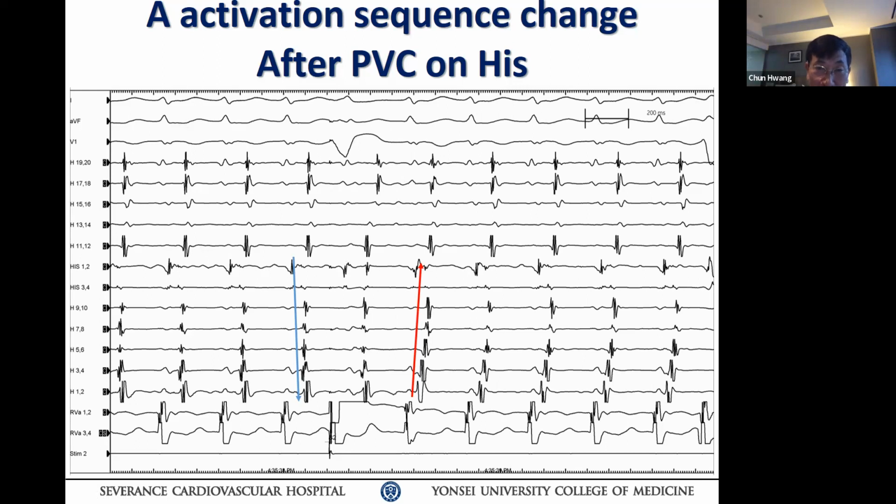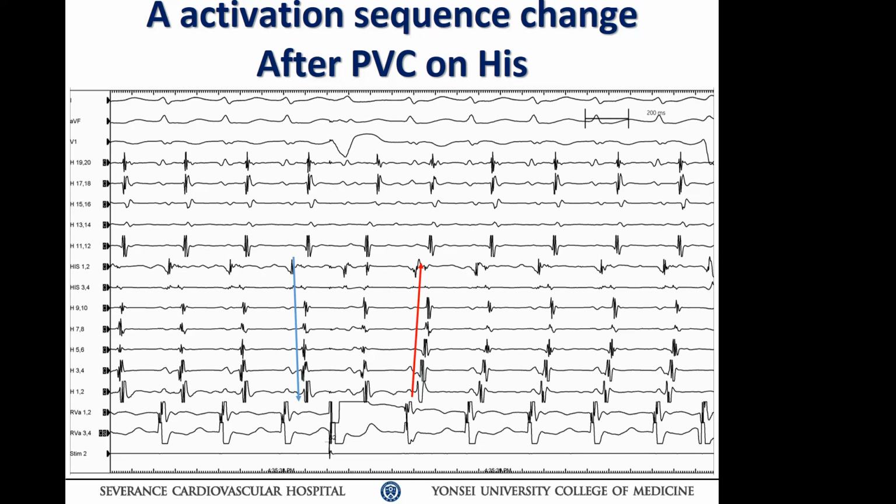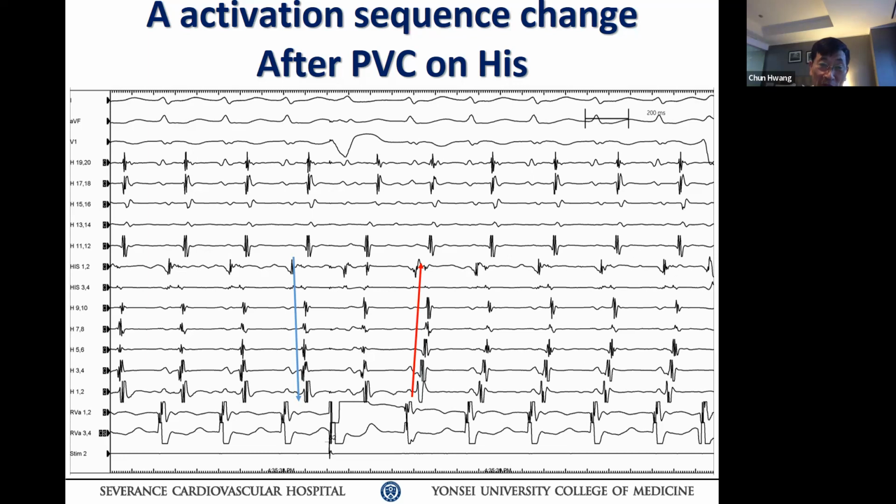But the fact is that in the subsequent beat, PP interval got shorter, yet you also have two eccentric activations. In other words, septal pathway plus left lateral A also became early, which suggests that that pathway cannot be decremental. 왜? PP가 짧아졌으면은 decremental property가 좀 더 길어져야지, BA conduction이. BA conduction the same. That's the argument that I have for you. Okay?